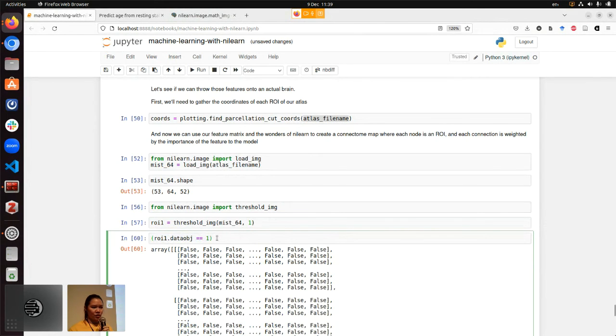What I would do over here is, first of all, I haven't done this for such a long time. You just provide that formula, and sometimes you generate an image directly, because here you only have an array.